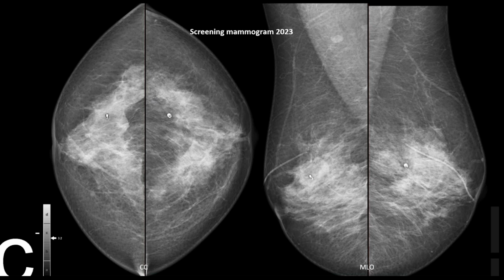She has postoperative findings in both breasts, as you can see depicted by those linear radiopaque scar markers. Her Power Look density assessment was a C, so the iCAD also agreeing that this is a heterogeneously dense breast patient. So if we go to the next slide.